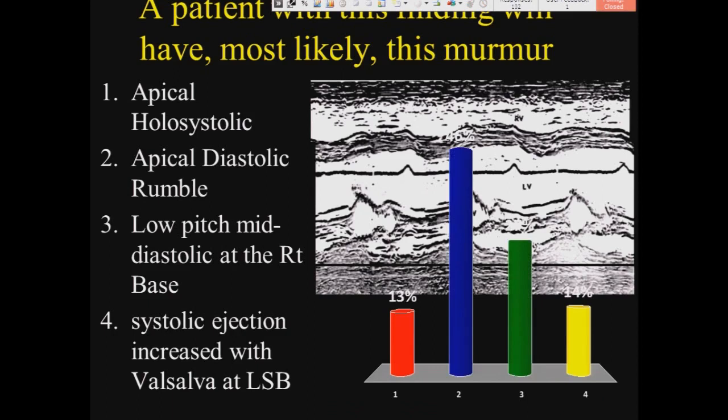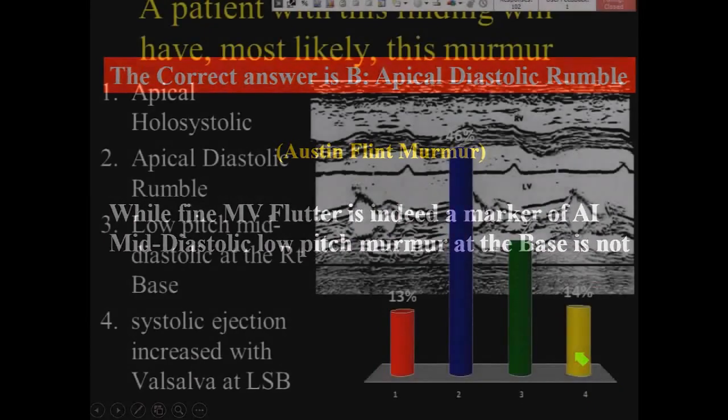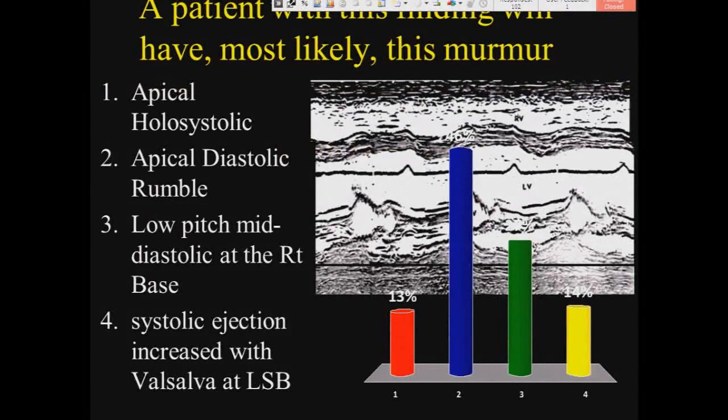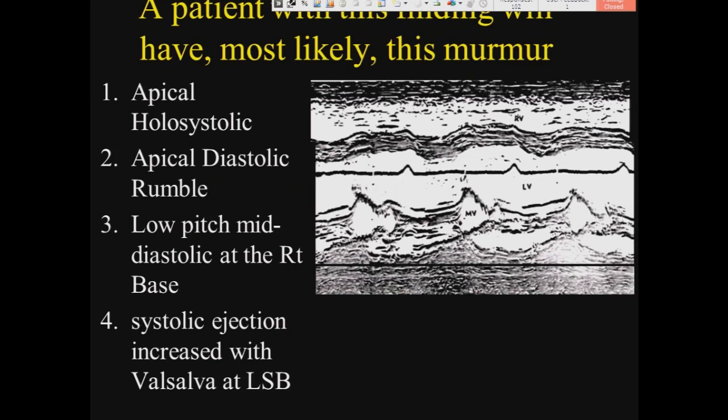Let's go back for a second. Oh, it works. Okay. So indeed, what we see here is a patient that has... go backward, 2 pictures. Go one more. Forward. Okay. All right, so what we see here is this.